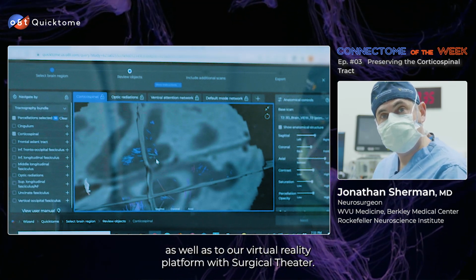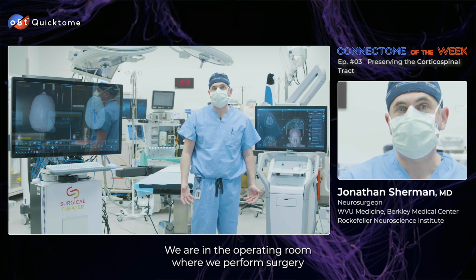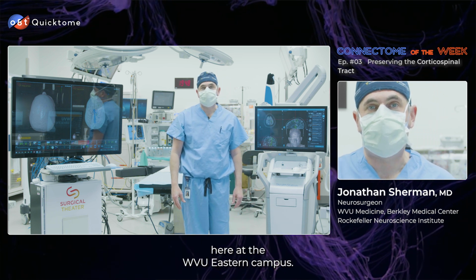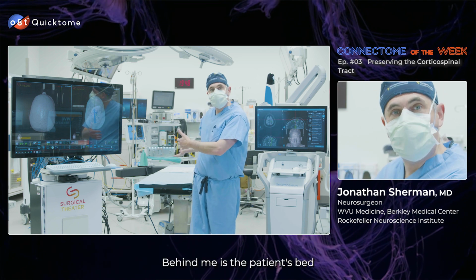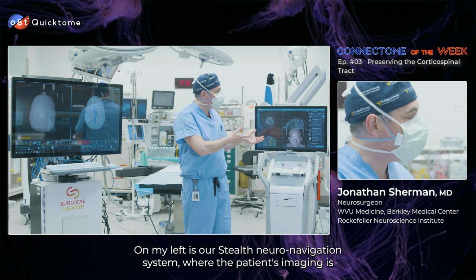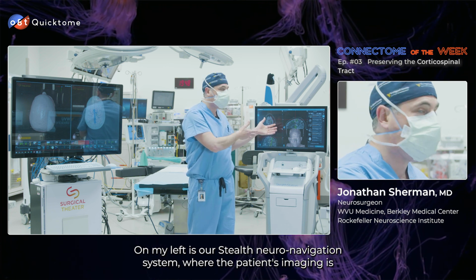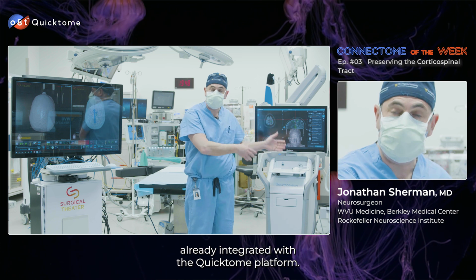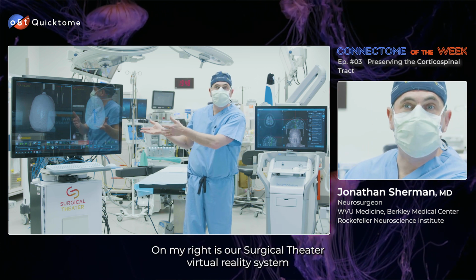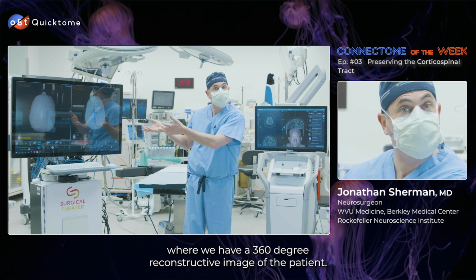We are in the operating room where we perform surgery here at the WVU Eastern Campus. Behind me is the patient's bed that the patient would have been sitting on the day of surgery. On my left is our stealth neuronavigation system, where the patient's imaging is already integrated with the Quicktome platform. On my right is our surgical theater virtual reality system, where we have a 360-degree reconstructive image of the patient.